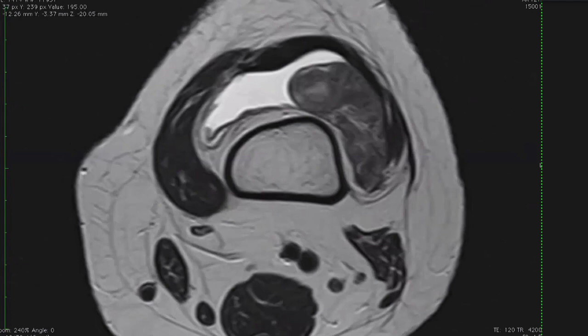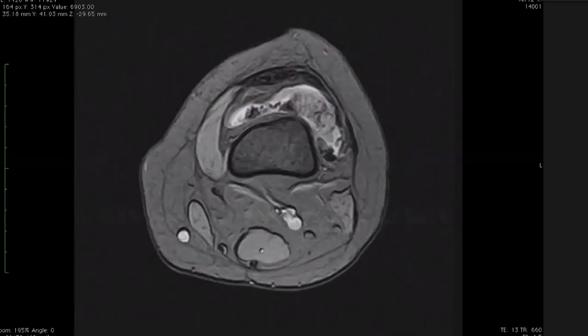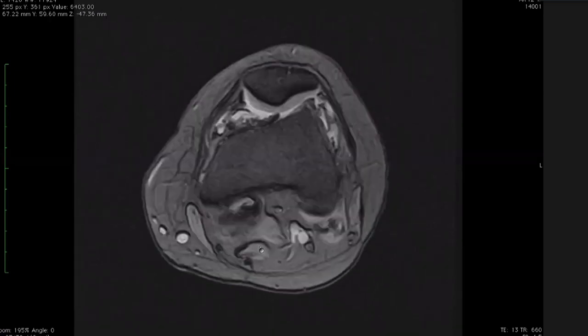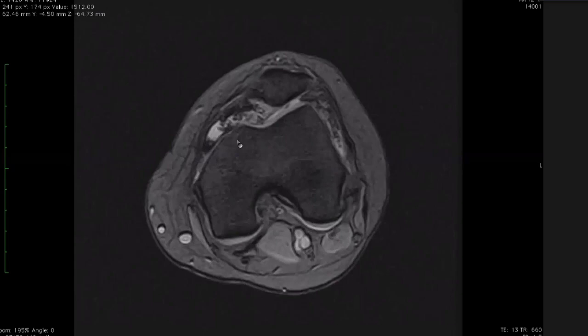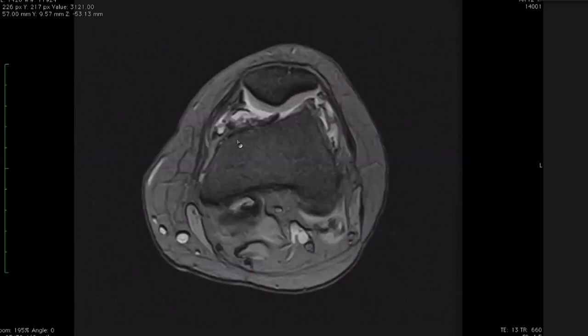And it is hypointense, like somebody said GCT of the bone is hypointense because it's got hemosiderin. Look at that. This is the gradient image now. You see the blooming? All this is hemosiderin-laden synovial proliferation. This patient doesn't have hemophilia. This patient didn't have any trauma. He is not on any anticoagulation. So all these things are excluded.